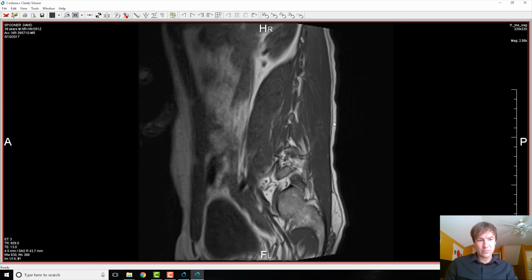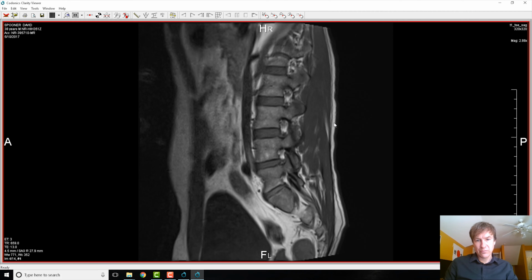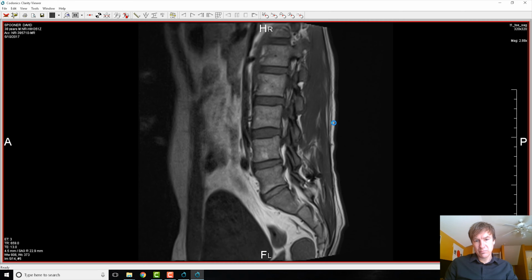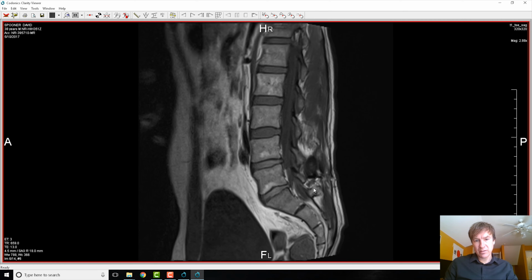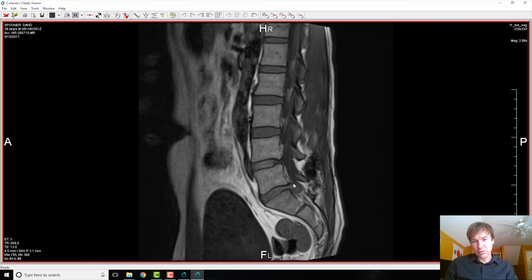Okay, so here we go again. Next image. Moving from, I believe, the right side to the left side. Keep an eye on this. You see the bulge is pretty big already. And then boom, it's like way, all that jelly material's out here.